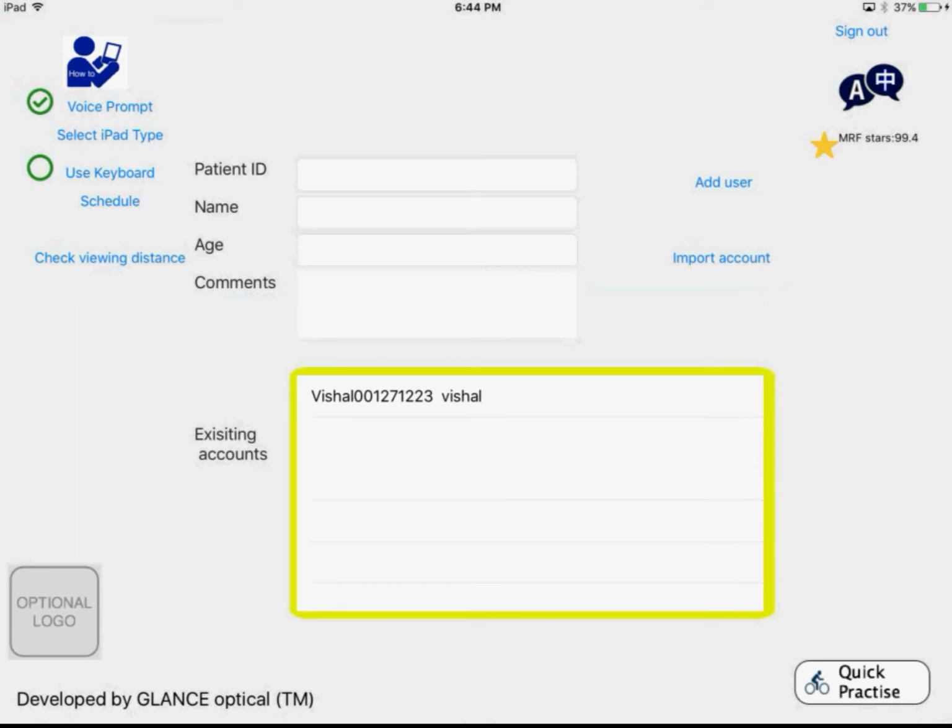The viewing shield does a couple of things. It helps maintain the correct distance from the screen for doing the visual field test, which should be around 33 centimeters or 13 inches. And also the viewing shield helps to deflect or block any kind of reflections or other lights that can interfere with the visual field testing. And it provides a little bit of a dark environment to do the test.